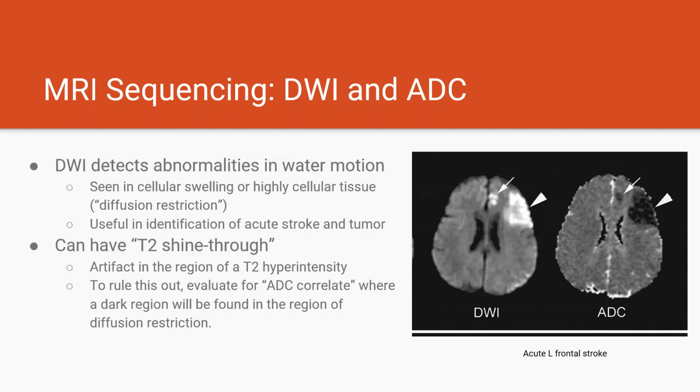I know that's complicated, but it's really important to understand. We use DWI and ADC very frequently. It's important to know what it is and know what is and isn't a stroke or an acute stroke.